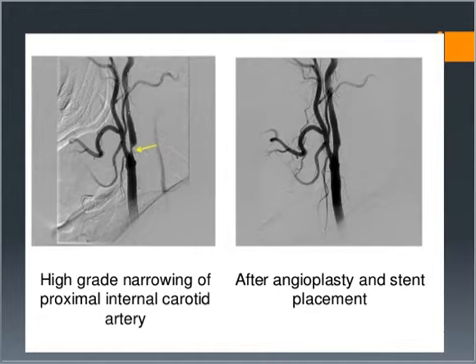Through some of the images here for interventional radiology. So this one here, you've got two images. The first slide is a patient who has stenosis, or narrowing, in their carotid artery. You can see where that arrow is. See how this artery would normally just come straight up here? Well, it's narrowed down to a very small portion right in here.